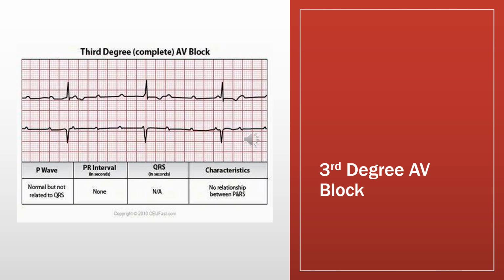If the heart rate's really slow and there's a P wave with no QRS complex, and you have second degree block, and you're seeing it intermittently, then it could be related to the dexmedetomidine, and you can prove this by the administration of atropine, so an atropine test, and if that fixes it, then it was associated with the bradyarrhythmia.